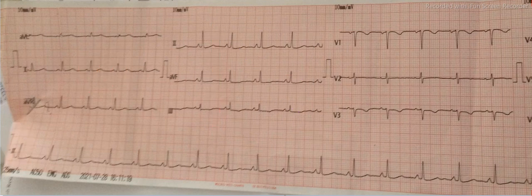When the vectorial axis is normal, we can rule out right ventricular hypertrophy or left ventricular hypertrophy or something like that, isn't it? We can also determine the axis of the individual atrium. In this case, in lead 1 the P wave is positive, and in AVF it is also positive. So if you draw the resultant, like the previous ventricular one, it might fall under the same axis, but we will not go into that. We will just focus on the ventricular axis first of all, learning at the basics.